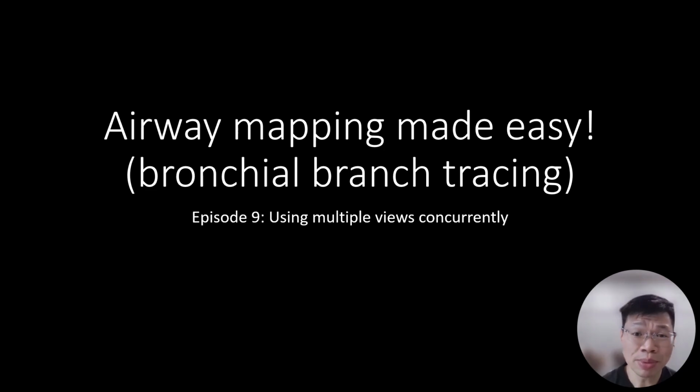In today's video, I'll be taking you through an airway mapping using multiple reconstruction views to tackle more complex branching patterns. If you find it challenging to follow along this tutorial, please feel free to visit the other videos on my YouTube channel to review the concepts of airway mapping.